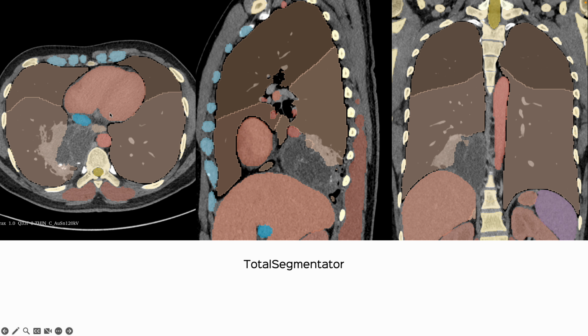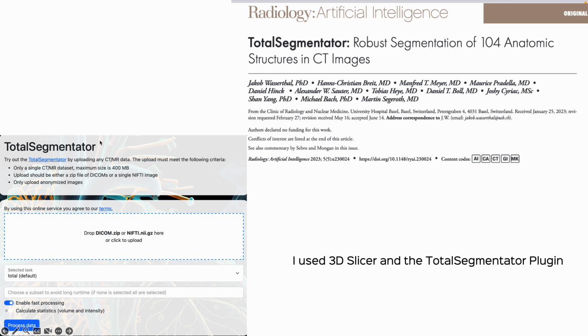But it does an amazing job. You can see the three different shades of the lower lobe, the upper lobe, and the middle lobe here. And it segments out the rest of the organs, and it doesn't segment the tumor-like lesion. So it shows it really well. This is the article that they keep telling you to show, but whatever, this is such an amazing tool.